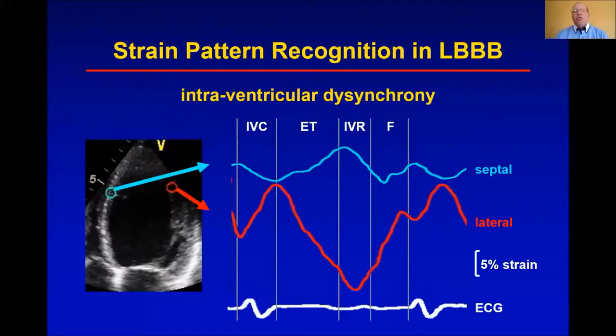So I was talking about visual assessment of mechanical dysynchrony, but we are talking here about strain. So what is strain good for? Yes, you can show exactly these changes in mechanical and regional mechanical function in the strain curves. If you're not trusting your eyes, or if you're not sure what you should say about that, maybe if it moves too fast or whatever reason, just do a strain analysis and you are very clear.